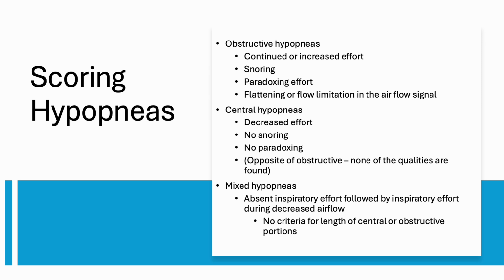Mixed hypopneas start with no effort for the central component, followed by effort for the obstructive component. There must be a 30% signal drop throughout both components.